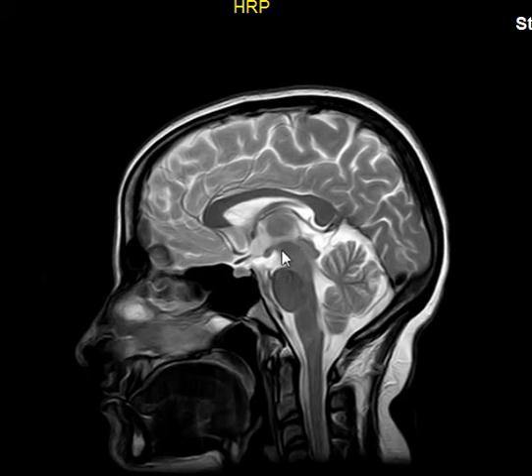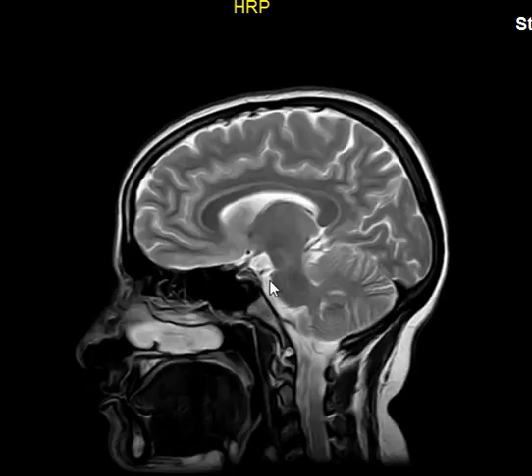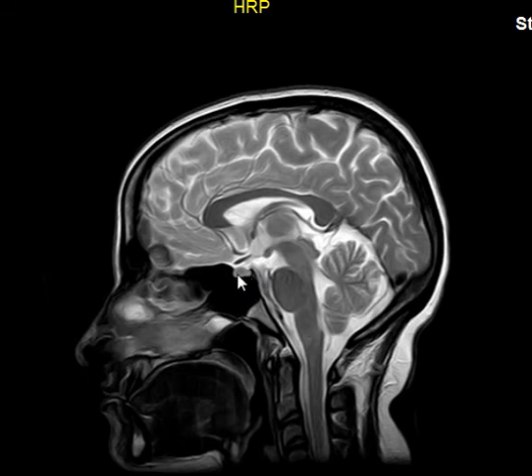You can see this is the midbrain with the mammillary body. Then anterior to it is the hypothalamus, and the hypothalamus gives you this dot which rests in this curve. This is the pituitary gland resting in the sella turcica. Inferior to it is the what? The sphenoid sinus. So this is the dark thing that contains air, the sphenoid sinus.